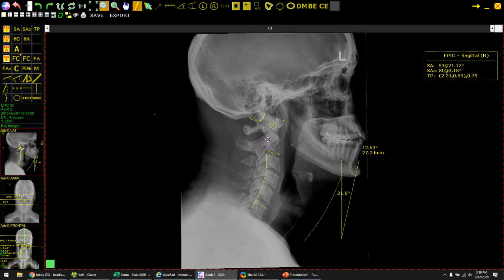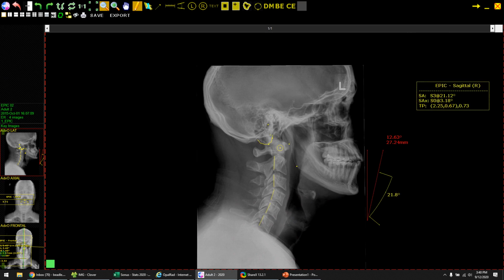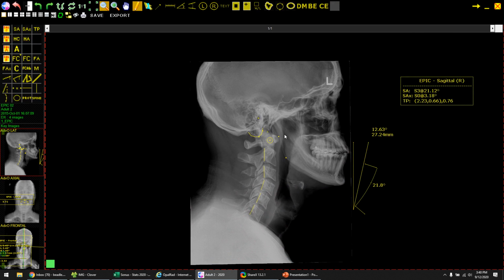So one of the first things we do is we describe George's line, so we can see that. We look at the curve of the neck globally from just like a Cobb's angle perspective, looking to see how far forward the head is in comparison to C7. So C7 up to C2 right there for the anterior head carriage. We also scribe right here how to triangulate where the transverse process of C1 is. And that's mainly it from this side. We're also using this to know really where to adjust, triangulating that transverse process. But we're not getting much more data than that as far as numbers are concerned.